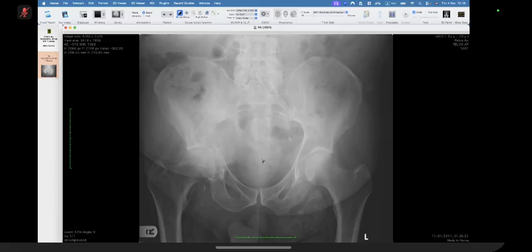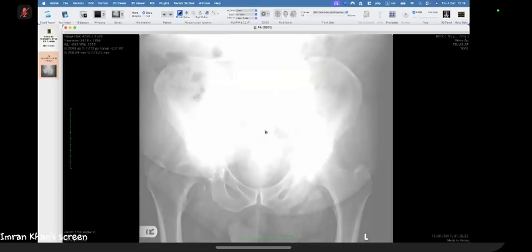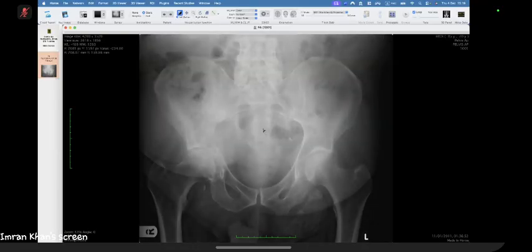Okay. Anything else? Before we move on, you may have time for another case. So the femoral necks, femoral shafts appear normal. I'm not very happy with the windowing of the femoral heads, so I cannot comment on the sclerosis that is visible over here. I think femoral heads are absolutely fine, but I've windowed it a little bit.